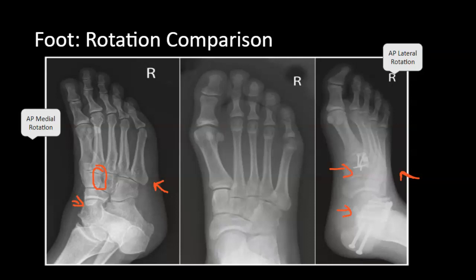The middle projection here is supposed to give you a reference point. Because of the distortion with the copying and pasting of the image, it may be a little hard to see some of the anatomic structure, so you may have to go back to the original image to compare.